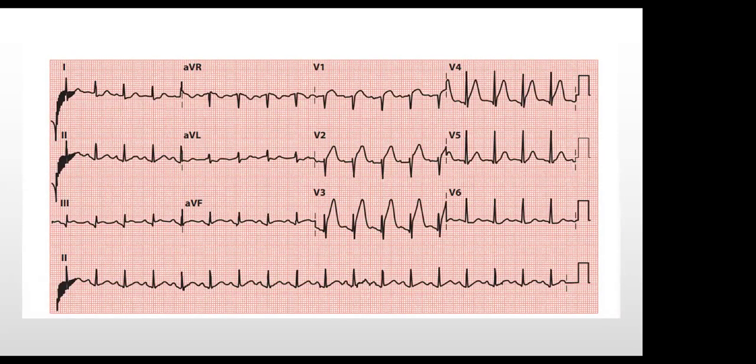So what do you think is this? There's anteroseptal ST segment elevation with very tall T waves. Tall and peaked. So this is an acute anteroseptal ST elevation myocardial infarction.